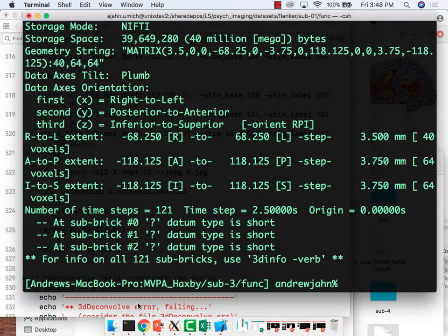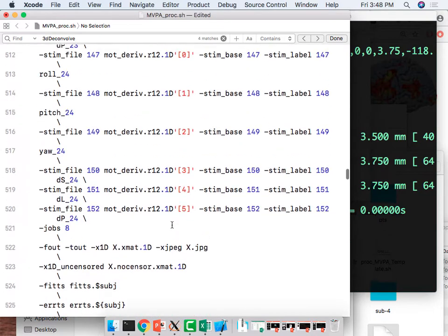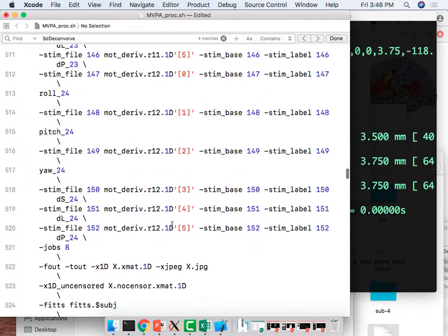Now that I'm thinking back through this, I think the reason there are so many regressors is because it's doing it for each run. So it may actually be the total number of time points across all the runs. So I think we actually might be fine. We're going to see. Okay, if this fails, game over and we're done. But that's my thought process. Again, they changed this recently to do it for each run, which is why we might see a bunch of these regressors. I think we should be okay.